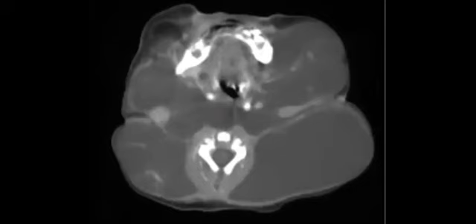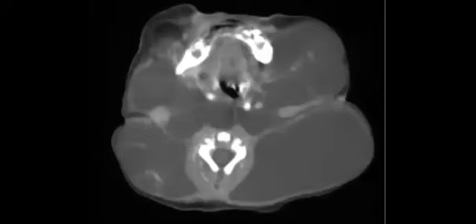Yes, okay. Your differential, just to check. Yeah, and they like to show you on the MRI, the most important thing to mention is that it has what? A cyst with fluid level insinuating between the tissues. Yeah, very bright T2 signal. The most important thing when describing it in the report is that it is very high in T2. The differential diagnosis will be abscess, it can be struma, it can be branchial cleft cyst.